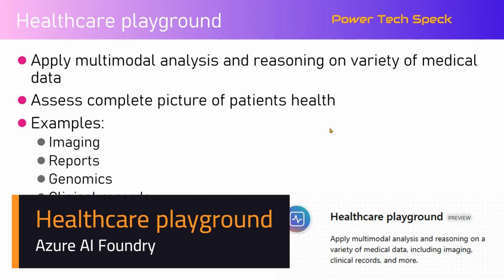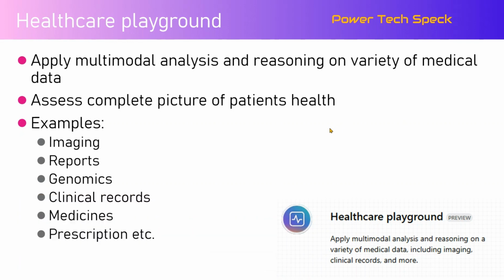In this video, I'm going to cover healthcare playground. Now, this playground is basically in a preview mode. So, healthcare playground allows users to apply multimodal analysis and reasoning on a variety of medical data. Now, the medical data can be your clinical record, it can be a prescription, it can be an imaging, it can be an X-ray, it can be a CT scan.